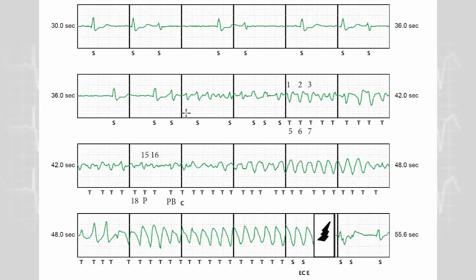Now if we try to analyze in detail the phase preceding the charge, I have added some markers to explain the different counters. During an episode of ventricular fibrillation, like in this example, there is always a delay before the occurrence of the first T marker, and this for two reasons. The first one is that the device calculates the heart rate as the average of the last 4 intervals. So you need at least 4 correctly sensed short intervals before the first marker T.